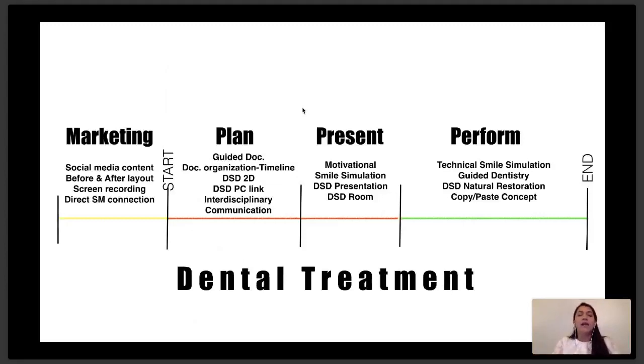It can also help you plan and communicate with your team. If you want to share any information with your team and your lab, you can do so with the app. Also, it helps you to present the treatment to your patients. If you want to present that treatment, using the DSD presentation, the motivational presentation, and the smile simulation, all of that can be done in the app.